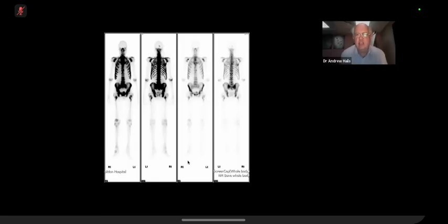Yes, radiation characteristically, at least after a while, produces decreased uptake. Often you get an area where there's a cut-off from radiation, it becomes very photopenic in a non-anatomical distribution with a sharp edge. So yes, this is right. The important thing here is that there are no kidneys.